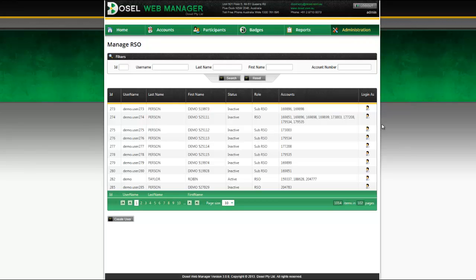For example, one of the background service is to create all imported dose reports previous day and pack it as one PDF file and store it on the server, and the link to that file is sent to the designated participants so they can see those reports they have been imported the previous day.